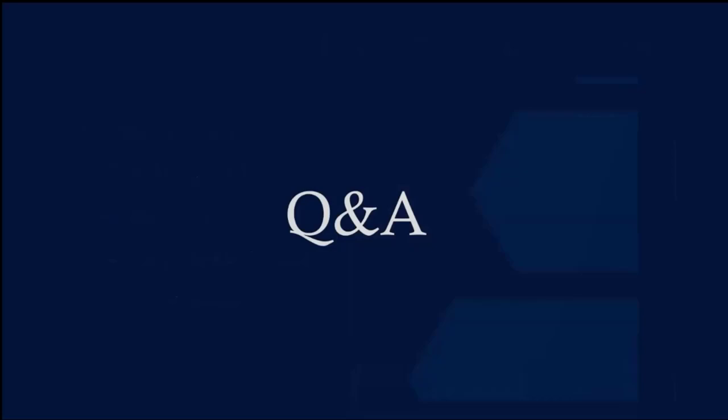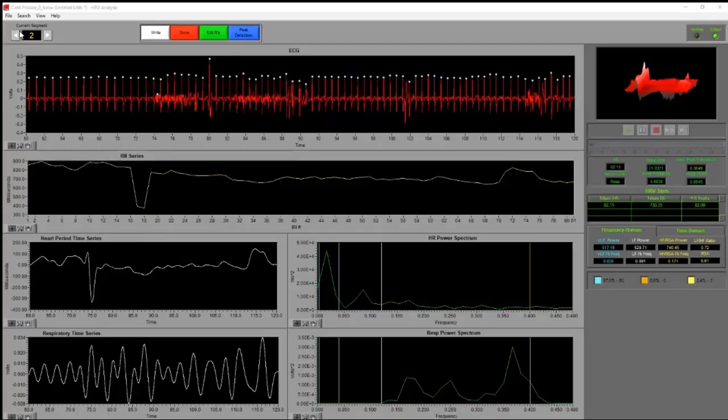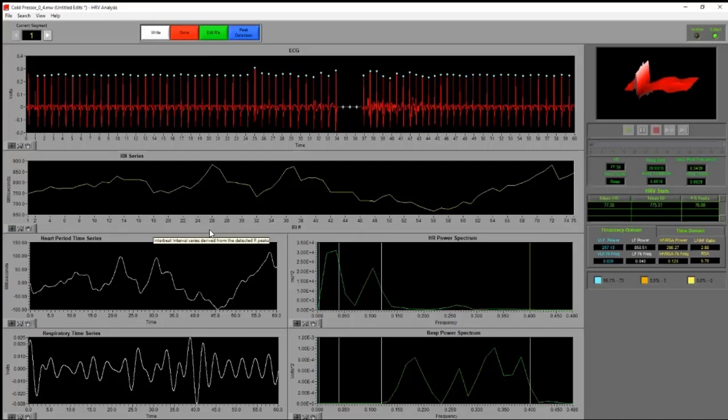Okay, so the first one I have here is how do I write statistics out? How do I compare between tasks? I might have moved over that a little bit quickly, so I will certainly open up the application again. What we would normally do, once we were editing the data, is confirm respiration, complete our edits, making sure we're under the 5 or 10%, whatever you're following, and then we'll likely write this out right here to Excel.